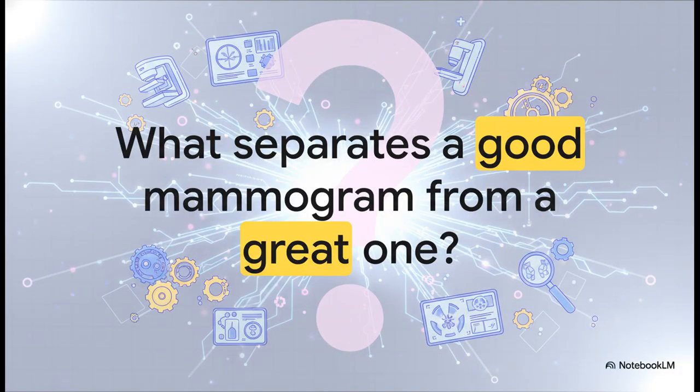It seems simple, right? But the answer is actually found in a ton of tiny, absolutely crucial details that can literally make a life-saving difference. So we're going to dive in and see exactly what those details look like from a radiologist's point of view.